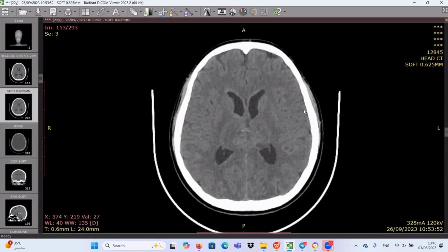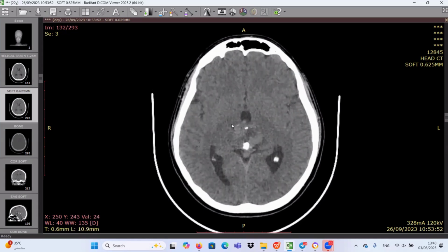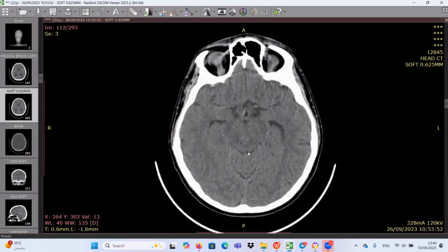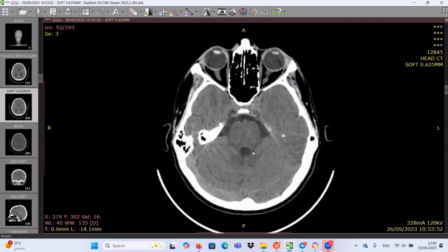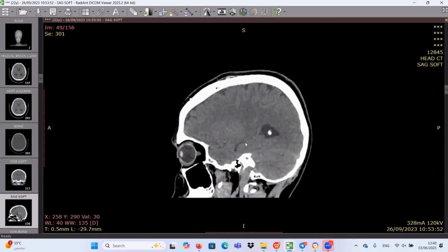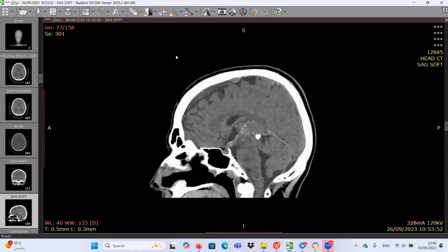You did very well, really. We have a relatively large heterogeneous space-occupying lesion, centered at the pineal gland, showing mainly peripheral calcifications. Do you have any more abnormality? I have to check the suprasellar area because of the possibility of a concurrent lesion, and I also should look for the presence of CSF seeding, and this should be checked on the post-contrast scan. Okay, very nice.